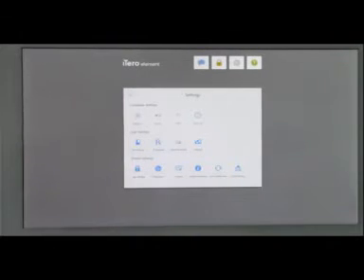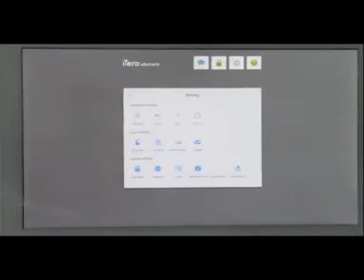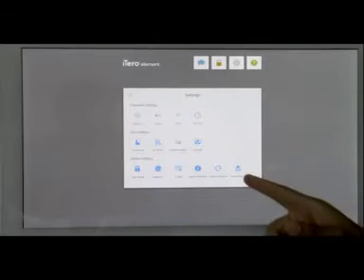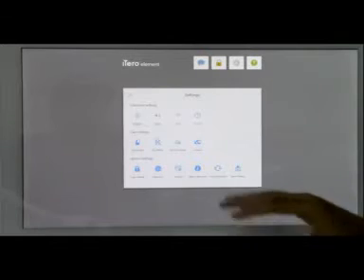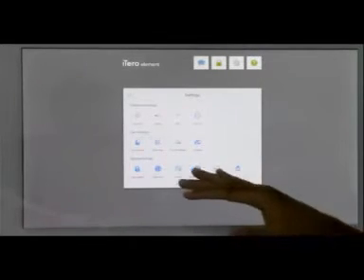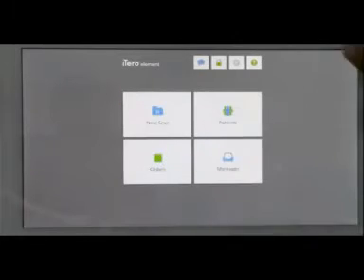When you add a new doctor, like I've just added a new doctor for you onto the system, you press sync and configure, and it will swirl, and then usually stop right there. That means everything that we have on our system will now be linked into your iTero. The rest of it you don't necessarily need right now, but you can adjust different things on there.